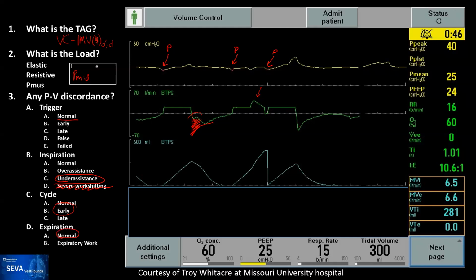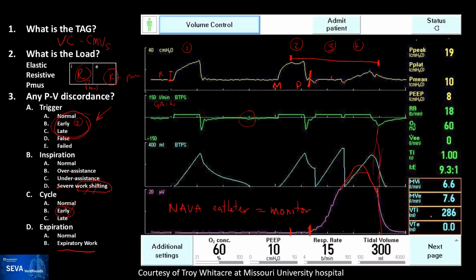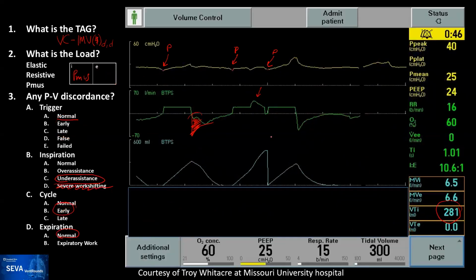Rob? Just a note that in this slide and the one before, the ventilator is displaying a tidal volume of less than 300, but in fact, the patient's getting 600 to 900 when he's stacking these breaths. Correct. Yeah, actually, on this one, the patient got 900. So in these three breaths, the patient got a high amount of 900, which means that the next exhalation, the waveform kept going below the screen. Yep. And on this one, you have 600 delivered with no alarm. And now the patient, if we allow them to exhale, should exhale 600.